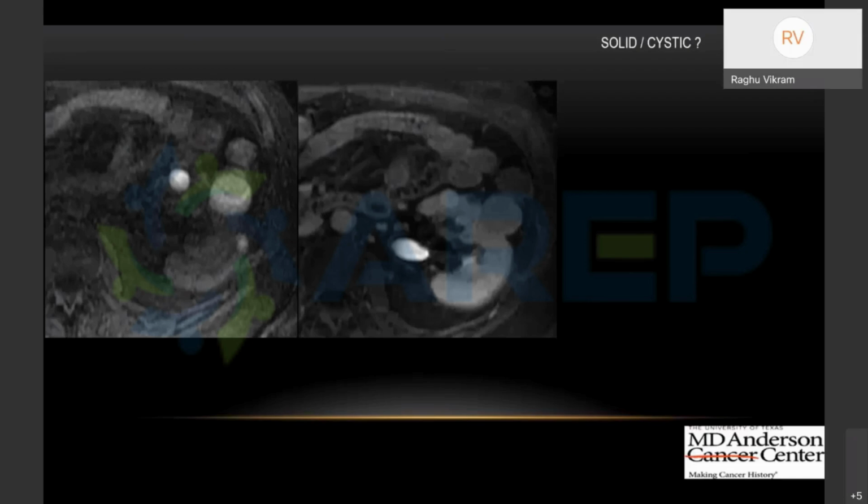Even in MRI, we can have the same problem. These are hemorrhagic cystic lesions, and you can see that here. And sometimes just by inspection, it is a little difficult to tell whether it is enhancing or not. What we can do elegantly in an MR is do subtraction imaging, that you subtract this image from this, and only those which enhance will be left behind.